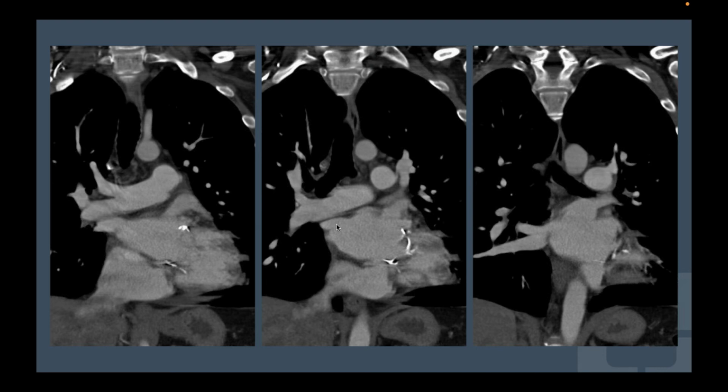Again, it was a nice pickup on the axial films by the person reading the case that day, who just felt the coronary sinus was way too large for normal physiology, and started looking a lot more closely. Did some recons, which are always useful, and I think we're way more used to recons nowadays than we were back in '06, but that's what this turned out to be.